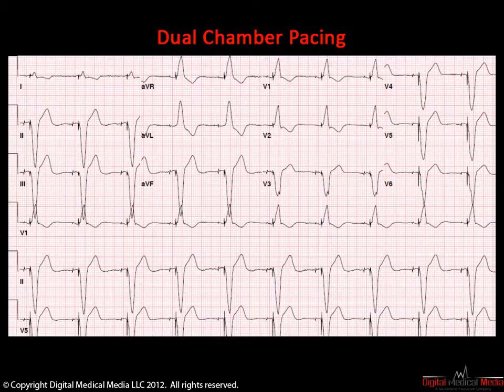The paced ventricular complex is typically wide, just like the one on this 12 lead, and of course repolarization abnormalities are present. Whenever depolarization is abnormal, then repolarization will be abnormal as well. Pacing is a typical example of both depolarization and repolarization abnormalities.